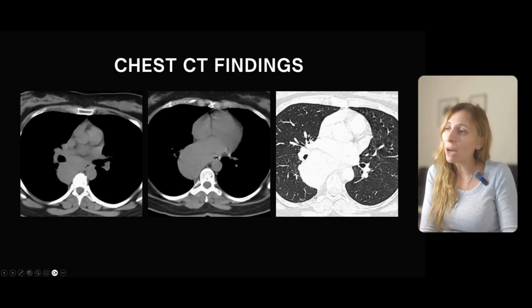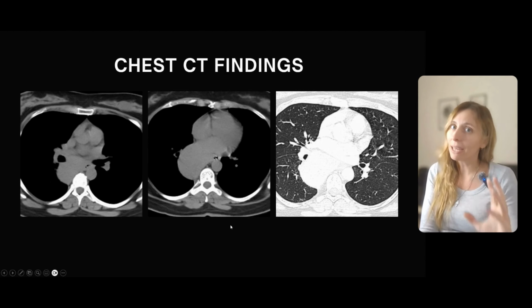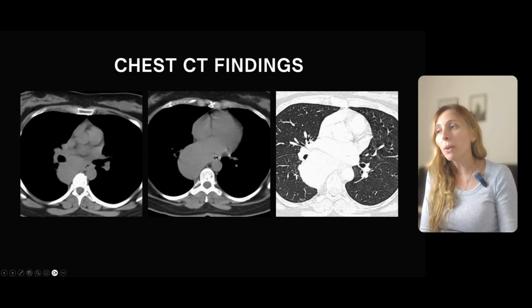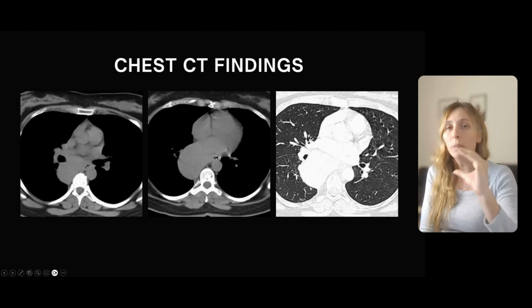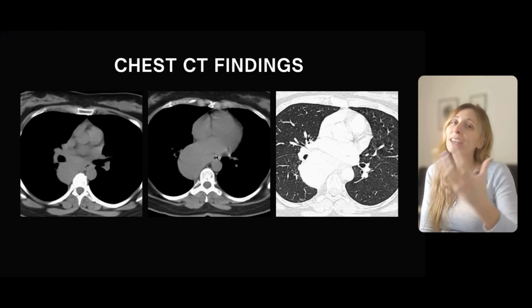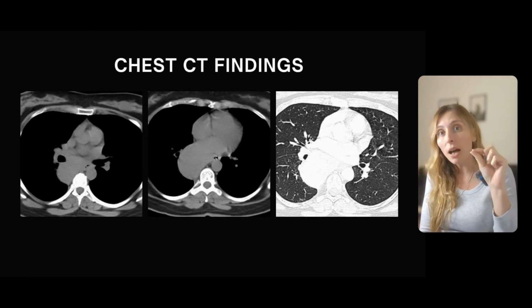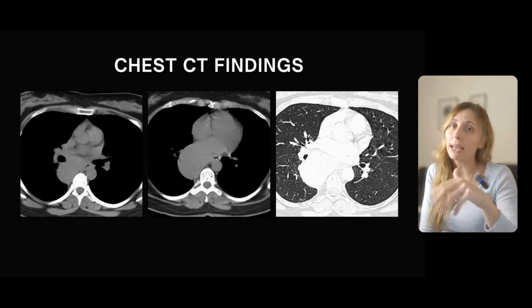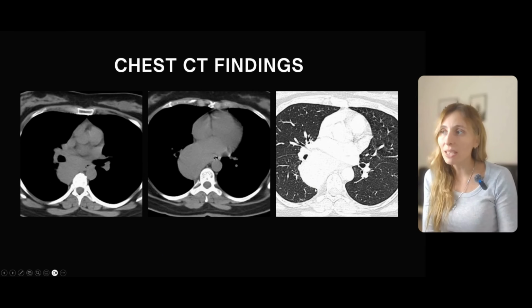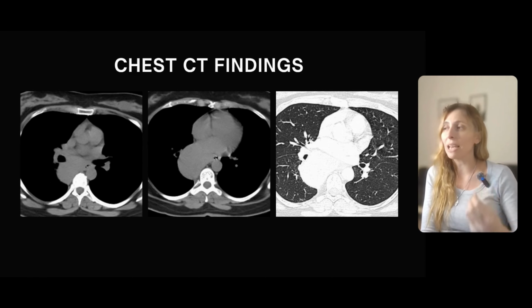And here you have another super important finding, that is the obtuse angle. Remember that this is not mathematics. If you have obtuse borders or obtuse angles with the lung parenchyma, you are probably seeing an extrapulmonary lesion. Meanwhile, if you see acute angles, you might be analyzing a lung lesion. So this is very helpful. With this study, we confirm that this is a posterior solid mediastinal lesion.